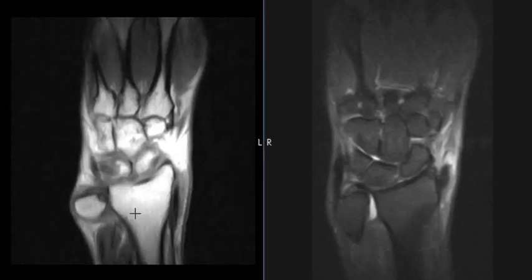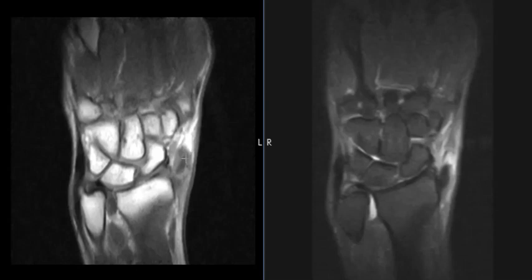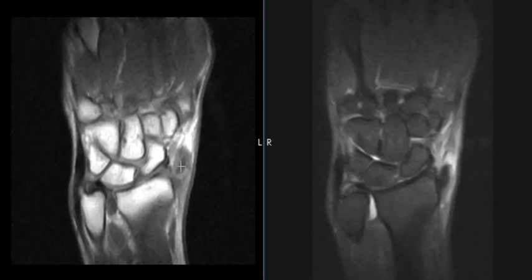This is a 56-year-old female who complains of swelling and pain along the radial aspect of her wrist. This is the radius. This is her ulna. She does have a little bone erosion here of the distal ulna and some other findings, but her symptoms are really along the radial margin here. She feels a sense of fullness, pain, and tenderness for several months. She's had no prior injury.